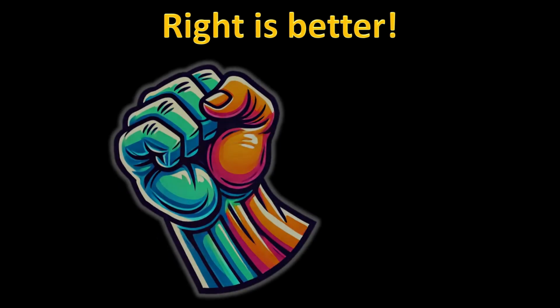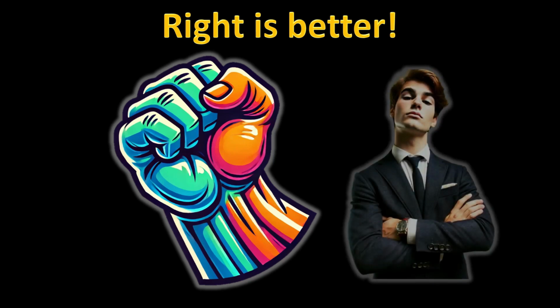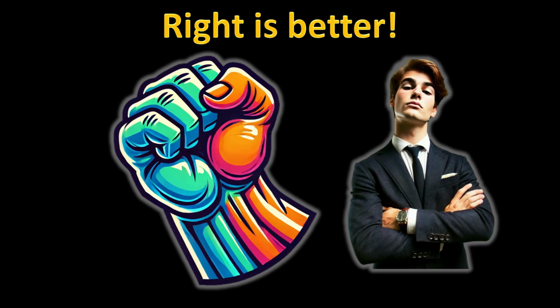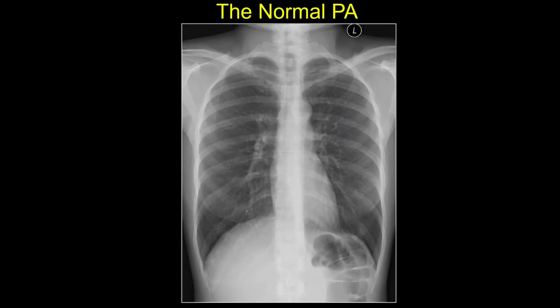In many cultures, the right hand or the right side of the body is considered better and superior. So in many religions, many cultures, the right hand is considered the good hand. Similarly, to remember this fact as well, remember that self-righteous people think they are superior and ahead of all others. Keep this in mind as we proceed with the lecture. It will be of use as we explain further. The easiest things to identify on the lateral x-ray would be the heart and the aortic arch.